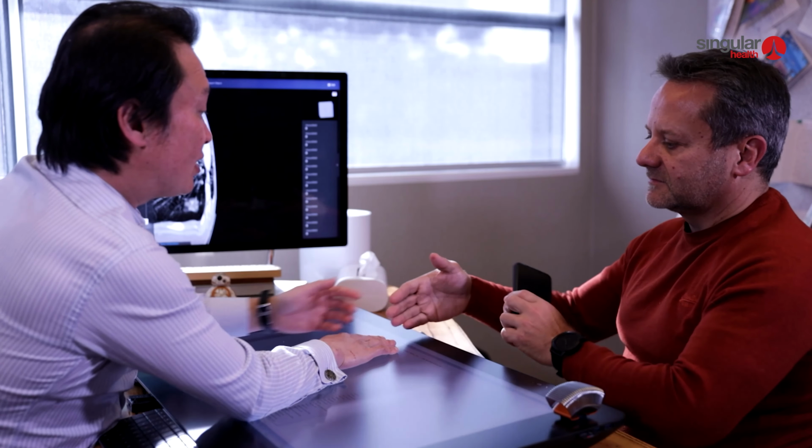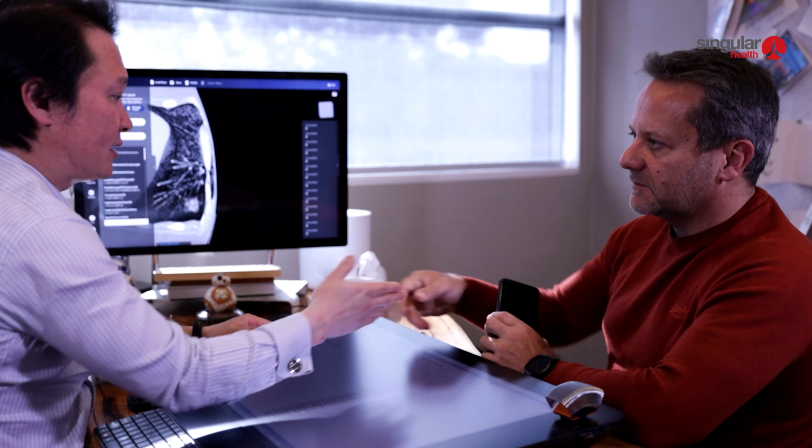And if you have any questions, just send me an email, and we can point things out on the scan for you. Great, thank you very much. No problem. So there you go.